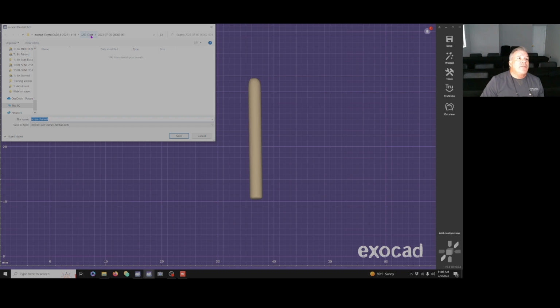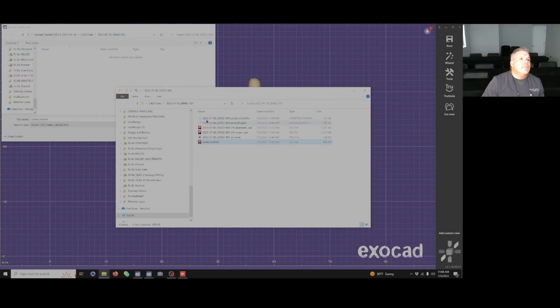I'm going to go back to the other location. Where is it at? It's right there.